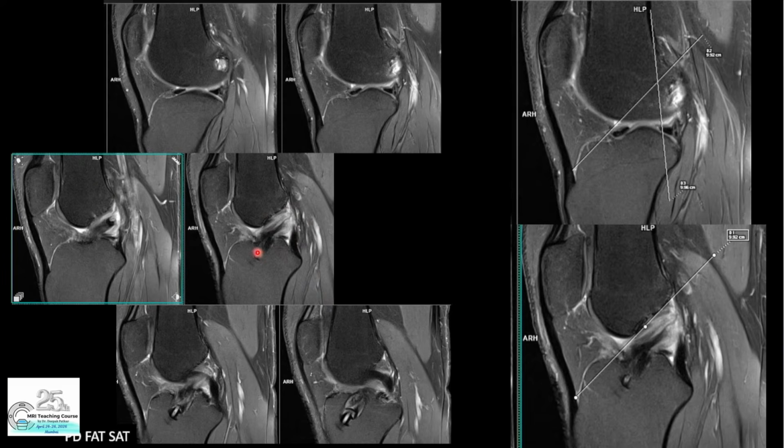So we can see the graft which is hyperintense. As I told you, a hyperintense graft 6 months post-operative, that is less than 1.5 to 2 years, is still allowed. It can be hyalinization, it can be neovascularization. Assessment-wise, the tibial tunnel is okay, the femoral tunnel maybe one can say is slightly posteriorly placed. But can anybody spot any abnormality along the graft?